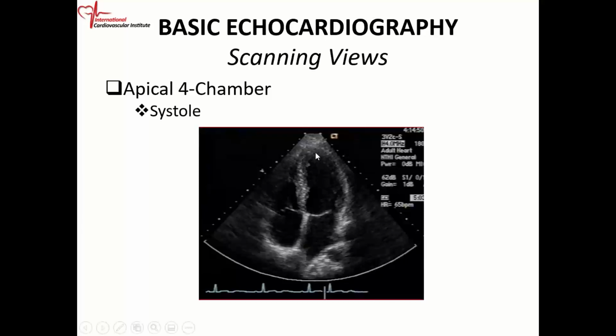So when you get a heart like this, we know that this is an atrioventricular valve. This is another atrioventricular valve. But if you look closely, this valve is actually lower in the ventricle than this one. Being lower tells you that this is the tricuspid valve and this is the right ventricle. So if this is the right ventricle, then the other is the left ventricle. If this is a tricuspid valve, then this is a mitral valve.